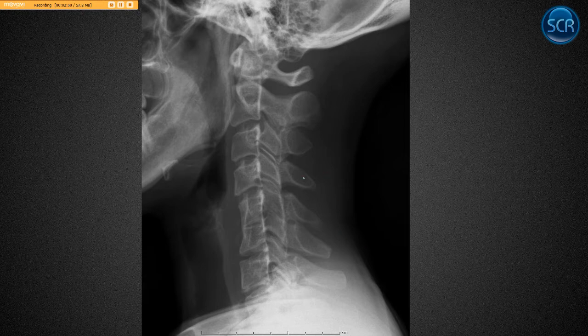In this example, basically normal, we just have a congenital block vertebra here. Okay, so we've got a wasp-waist deformity, small little rudimentary disc. Facets are fused back here. Looks like our lamina are probably close to fused, if not fused. So this is a normal congenital block vertebra.